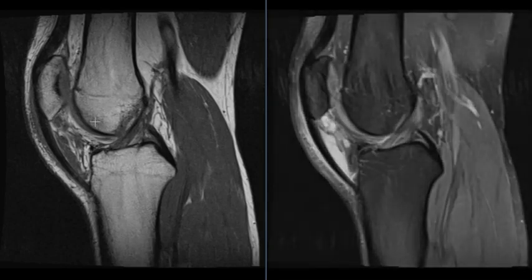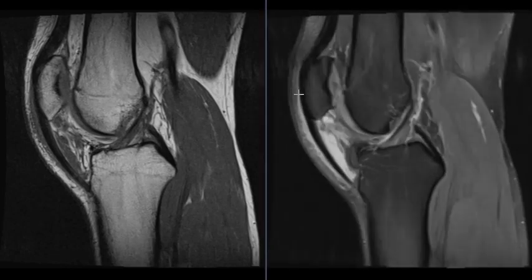But we can see that this is not in front of the kneecap. Prepatellar bursitis is localized to the front of the kneecap. It's not behind it or below it. And instead we see the prepatellar soft tissues. We have a little bit of edema, a little bit of brightness along this band, but really there's no big fluid collection in the front.